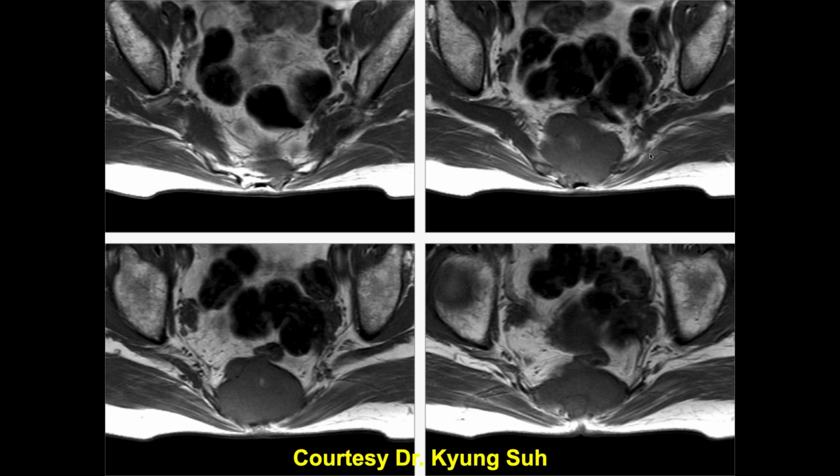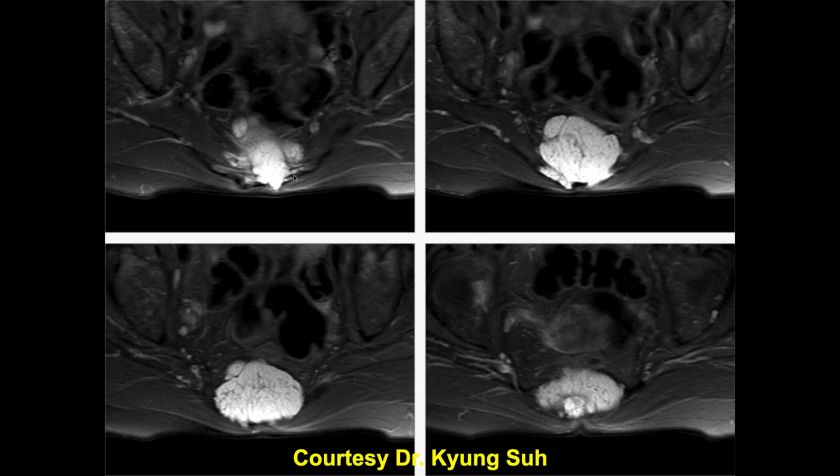Okay. So on the MRI images, we see this fairly well circumscribed, lobulated, predominantly homogeneous, intermediate to low signal. It's similar signal to the adjacent muscle. It looks like it's involving the central sacrum and extending. Yeah, it's within the sacrum itself.